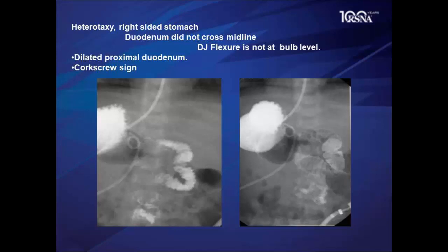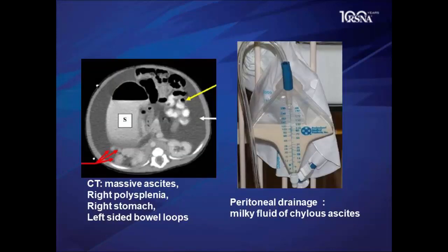I'm showing this case because this one actually spent many weeks in hospitals because of ascites, which was chylous, and people were thinking about malabsorption. Yet the chronic volvulus, devolvulus, volvulus, devolvulus causes the problem with venous congestion. That's why the patient was malabsorbing. So one has to recognize a chronic intermittent volvulus of malrotation as a possible cause for chylous ascites.